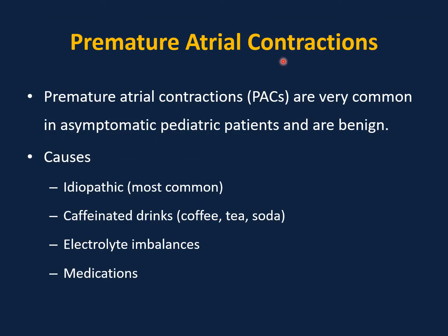Premature atrial contractions are very common in pediatrics, very common in neonates, usually asymptomatic and require only reassurance. No consultation, no treatment is necessary. Causes include idiopathic, caffeinated drinks, electrolyte imbalances, and medications.